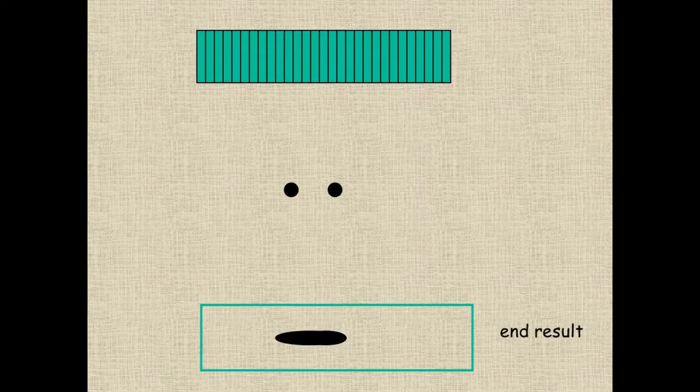The end result of this is that these two reflectors horizontally are seen as a single entity, which is what you see in the ultrasound screen at the bottom. So with that beam width, the machine has failed to discriminate between these two different structures.